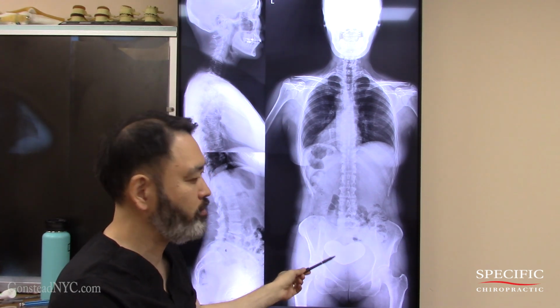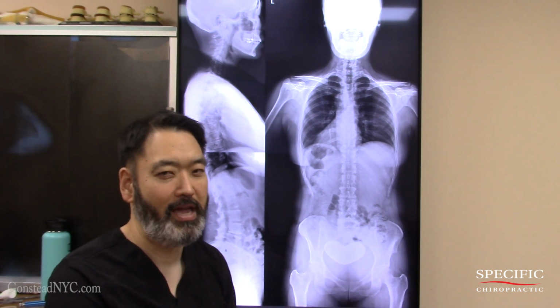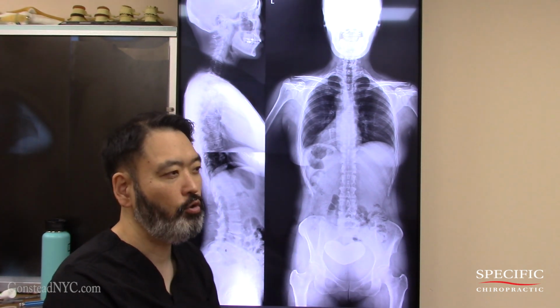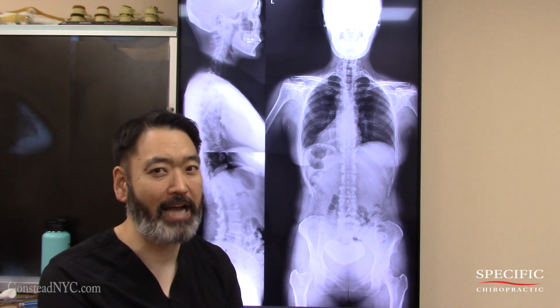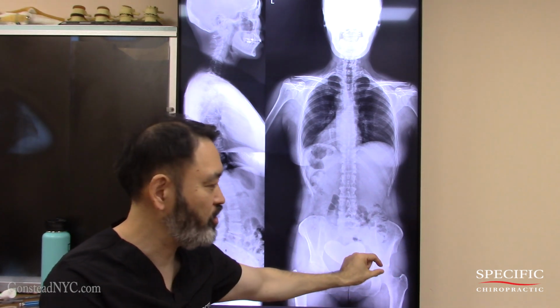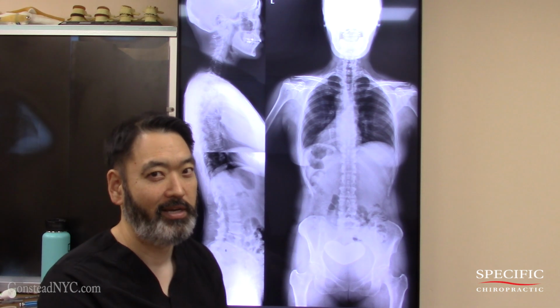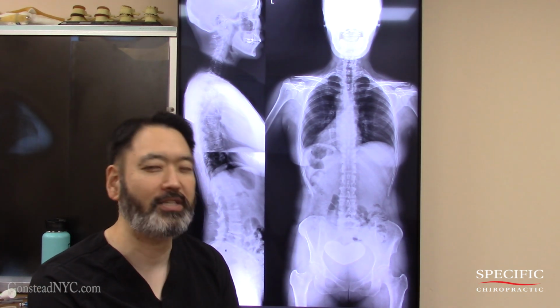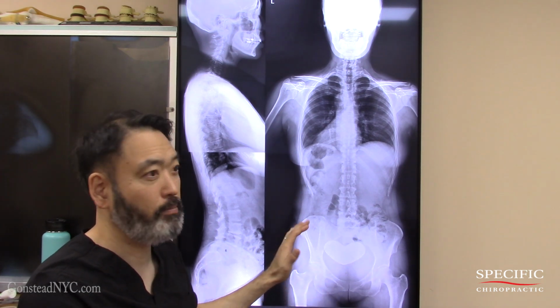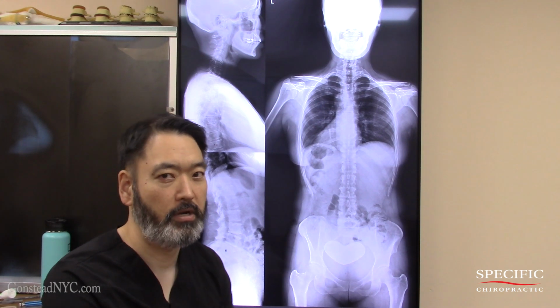So now the measurements is that she has a 7 millimeter MD, measured difference, and it will be a 10 millimeter AD, an actual difference. That means after we adjust it, she will gain an additional 3 millimeters, sinking down even more this way. So therefore, according to the chapters, or the textbook case would say, okay, we got to put in the full 10 millimeter heel lift onto that right hip.